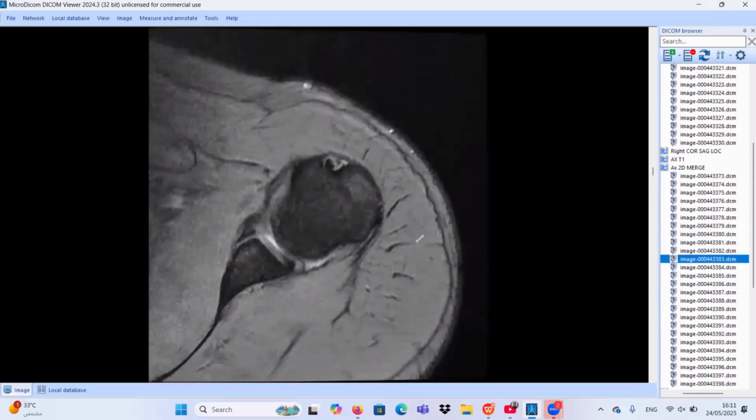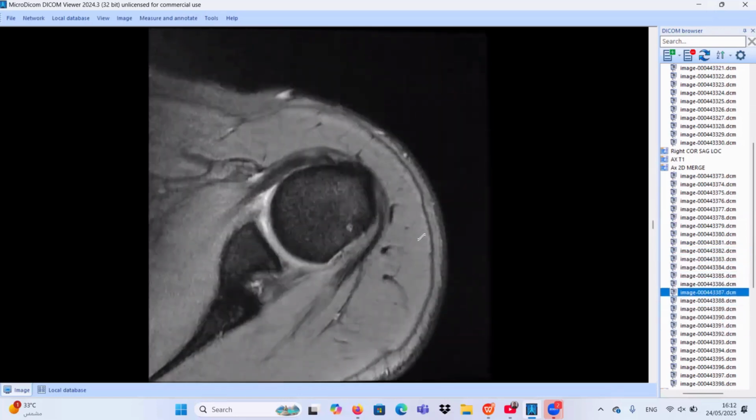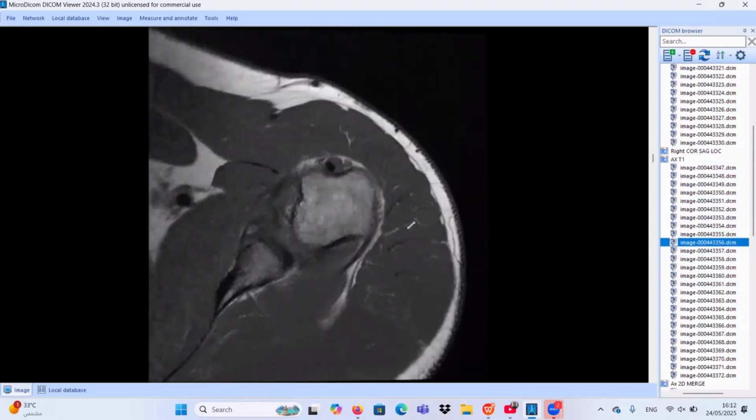But yeah, I agree with you that we have here a fracture line across the anterior inferior aspect of the glenoid and a separated bony fragment. This is the osseous fragment, the Osseous Bankart fragment. And we have here the labrum, and this is the periosteum. I think it's an intact attachment to the separated osseous fragment. So for sure we have here Osseous Bankart. I think axial T1 can also demonstrate the fracture very clearly. Yes, sir. And you can see here, this is the site of the fracture.